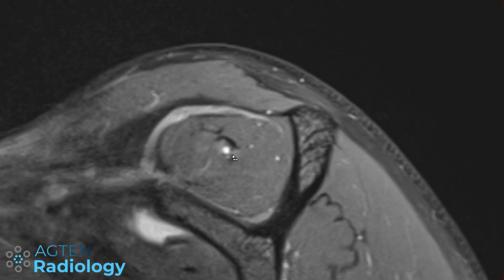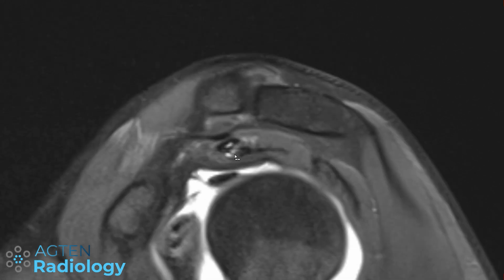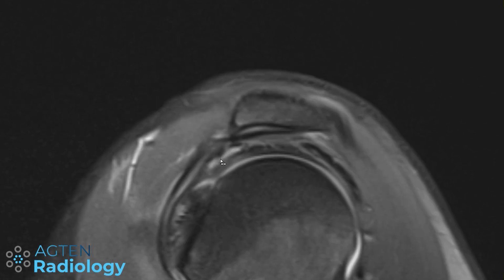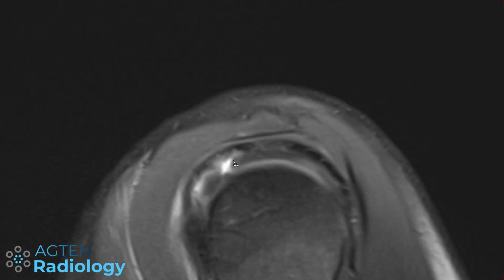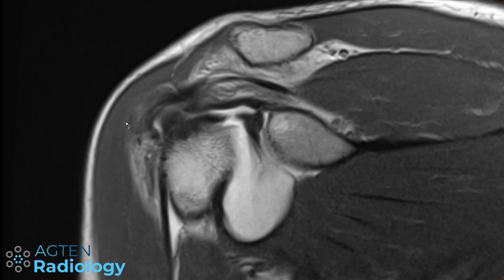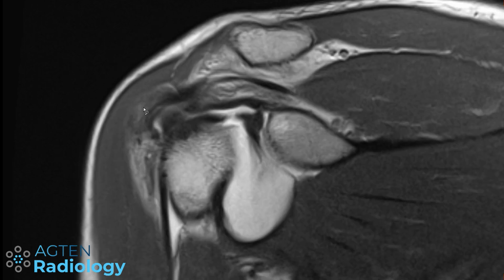Now, if you see here, you can nicely see this cyst, this sentinel cyst along the tendon. And then it's coming down here. Then here it has different components. This is a delaminating tear in the tendon substance. So this is the main tendon, that's the tear. And then we have a focal defect here. It's either a very high grade partial thickness tear, articular-sided, or maybe even a small full thickness tear. You can probably argue in both directions, because you might say that there might still be some fibers here that are in continuation. But then again here it's even more difficult.